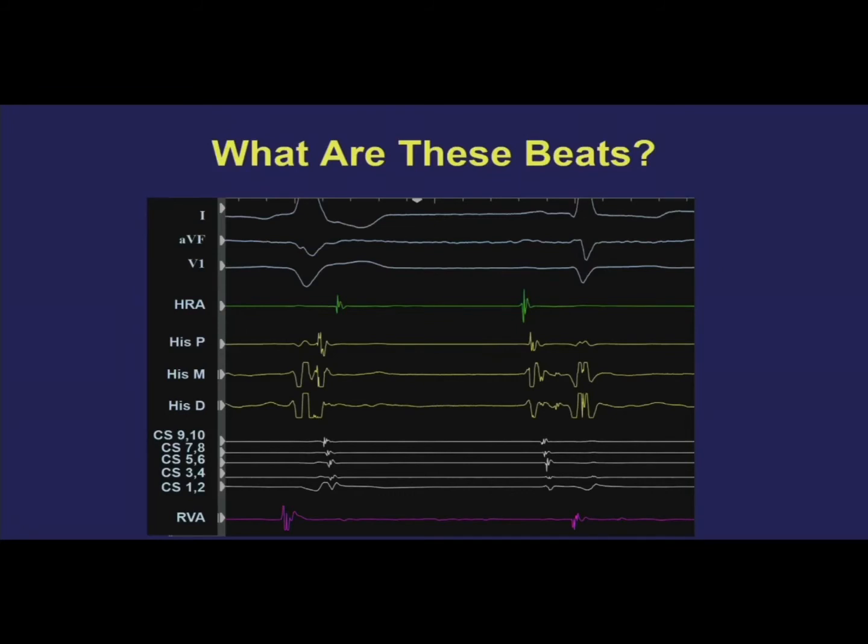I have to be able to hear it up here to tell you if you're right or not. And I hear murmurings. I hear ventricular retrograde conduction. So which beat are you referring to? The first beat. And that would imply that that beat is a PVC. And why do you say that?